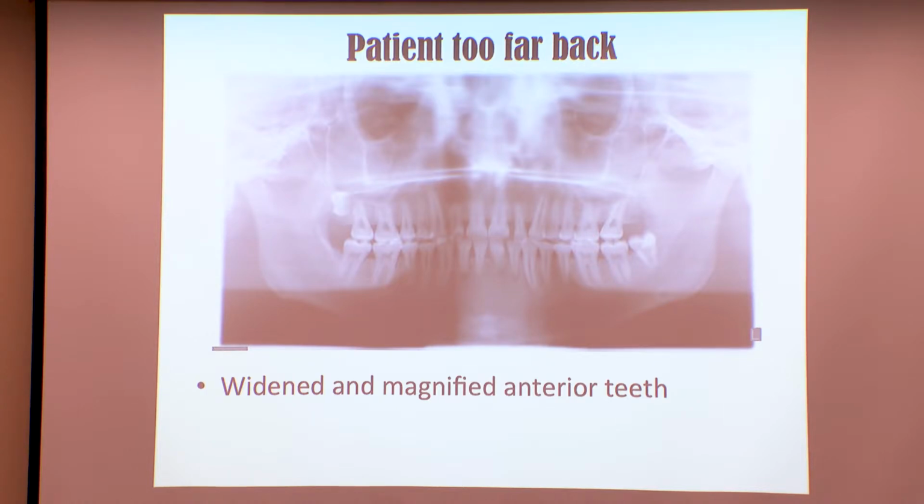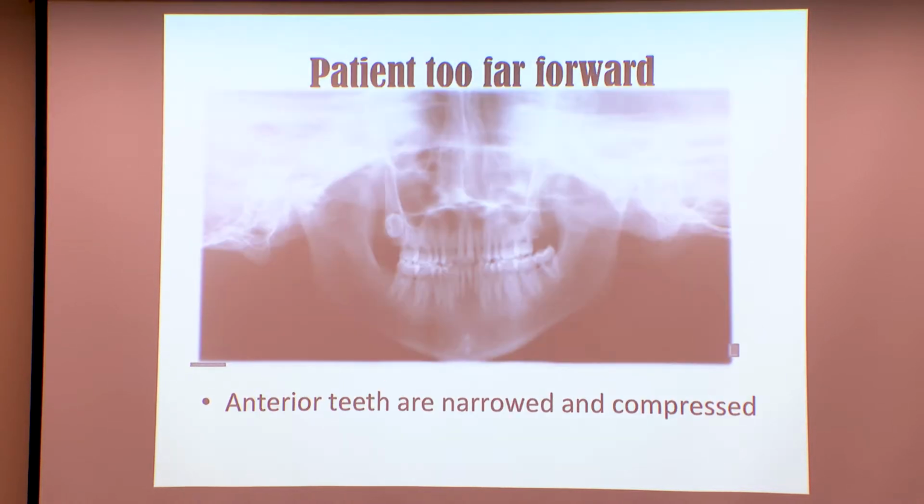If the patient is too far back, like back in the machine, away from where the sensor comes in the front, you get widened and magnified anterior teeth. And if the patient is too far forward, their face looks shrunken, so you can't really see the teeth very well.